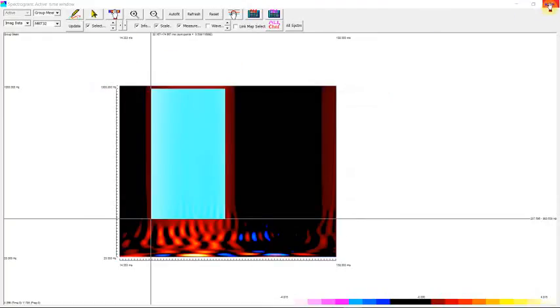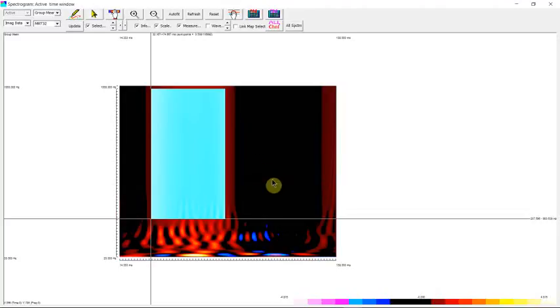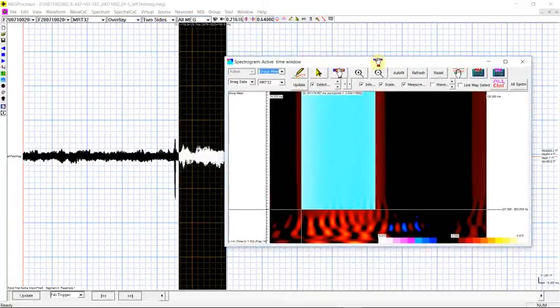So this is single trial. If you want to update the group, for example, you can uncheck this, and check this one, visible. You can change the visibility. Let's uncheck this, and click OK, and then we recalculate the group. Recalculate the group means. Basically, they recalculate the group mean, minimum, maximum power.